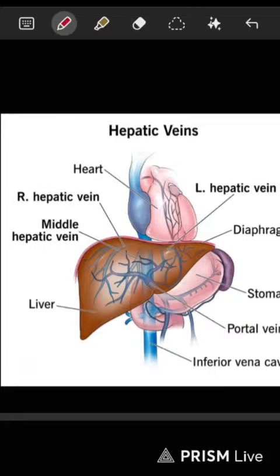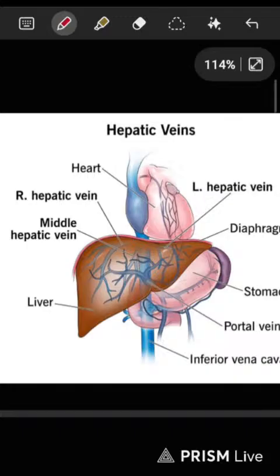So this is a liver. If you do the CT scan, you have to know the exact artery or vein, wherever it is located. So you have to learn that basic thing. I just provide you a basic idea, because I have to explain the thing in CT liver triphasic imaging.